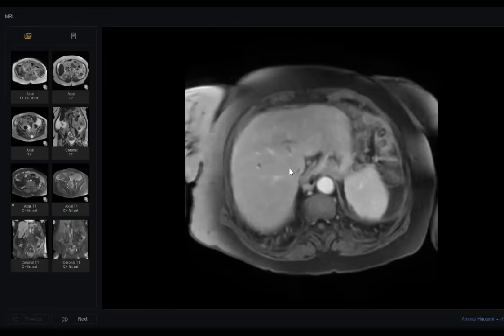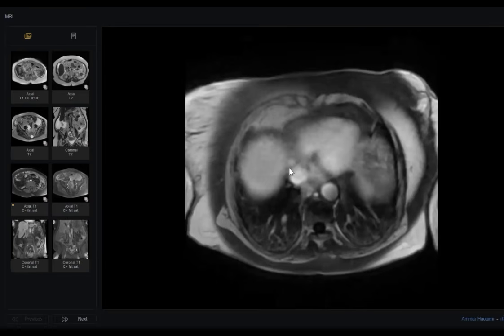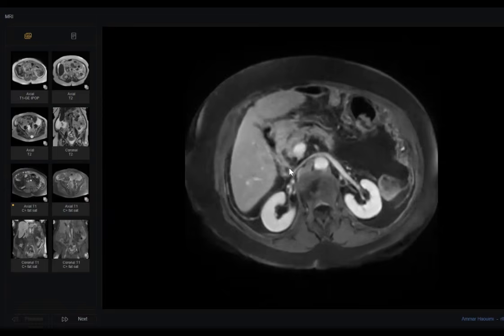No focal lesion is appreciated within the liver parenchyma. So my most likely differentials would revolve around CA stomach and CA ovaries. But I cannot appreciate any significant wall thickening within the stomach, so that is ruled out. Within the pelvis, I don't appreciate any ovarian mass lesion, but I would like to have another look if I can, sir.